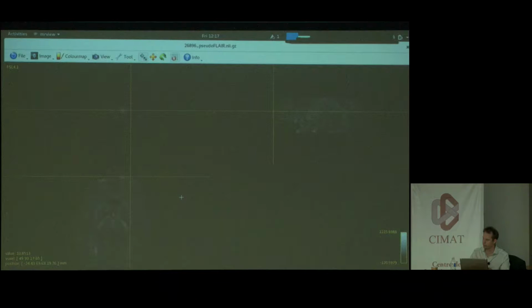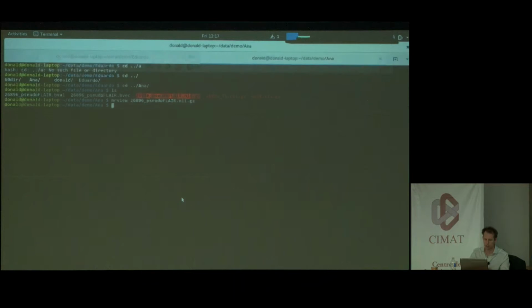Have you got multiple b-values in that one? That's 2 b-values. Okay. One thing that's quite useful if you want to figure out what's in your data: if it was an MIF file with a diffusion gradient table in it, you wouldn't need to pass the bvecs and bvals information. But I will.